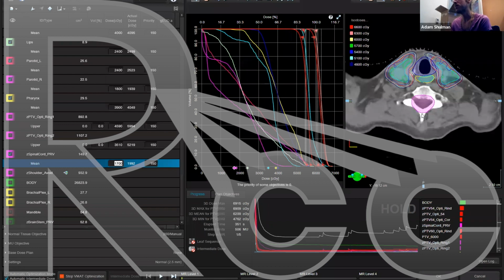The biggest importance with avoiding the spinal cord and avoiding the shoulders is this: lots of times we will have PTV that goes close to the spinal cord, and you've got a sharp dose fall-off, but you might have high doses near the spinal cord. That includes beams going through the shoulders. If the patient loses weight and the shoulders drop, now you've got beams coming in right where the shoulders used to be, but now there's no more tissue, there's no attenuation, and you can have a big increase in dose. That increase in dose can be right at critical organs. It can be in the spinal cord, for example.